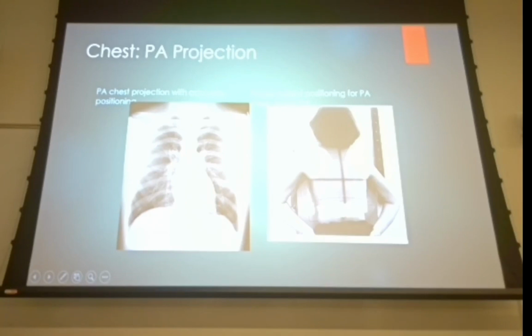So you've got 1, 2, then you've got 3 right up under the clavicle, 4, 5, 6, 7, 8, 9, and you've got a portion of 10 on the right-hand side, most of it on the left-hand side. So that's what we're looking at, the 10 posterior ribs.